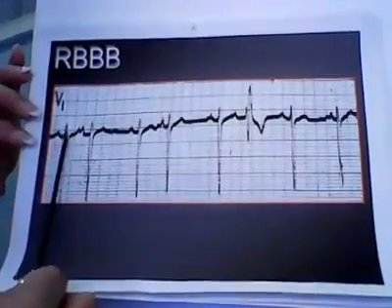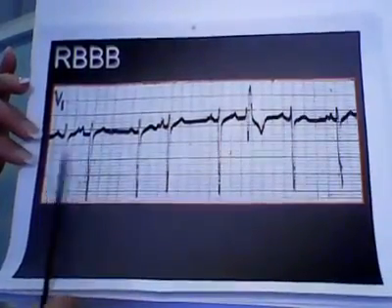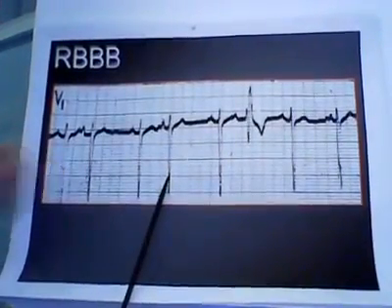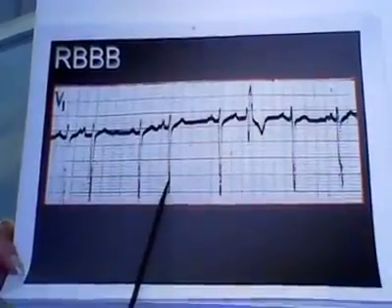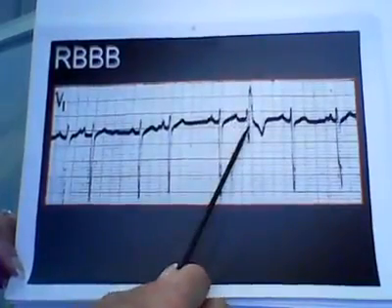This is a P wave, a QRS, and a T. P wave, QRS, and a T. So we do have a PAC, right? Matter of fact, here's a normal beat with a PAC. We're in V1 now. So we have atrial bigeminy. Normal beat, PAC. Normal beat, premature atrial contraction. Normal beat, right? P, QRS, and a T. And then he does that.